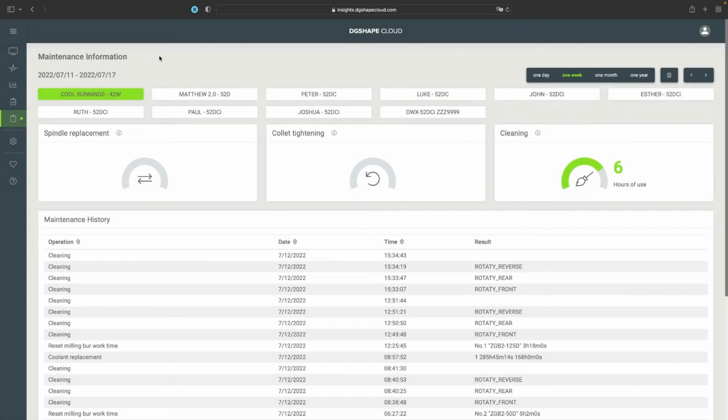Let's face it, when you're managing multiple tasks in your dental business and production demands increase, it can become challenging to stay on top of the routine maintenance procedures that help keep your devices running efficiently. This is where the Maintenance Information Panel can be very useful. It displays the elapsed time between maintenance procedures using color indicators to confirm when maintenance operations should be performed.